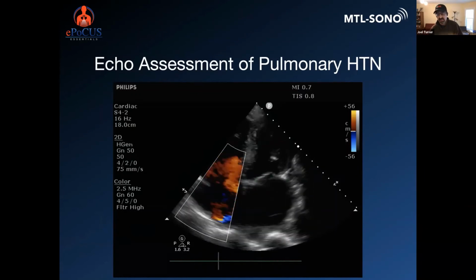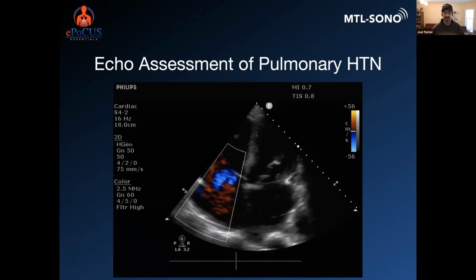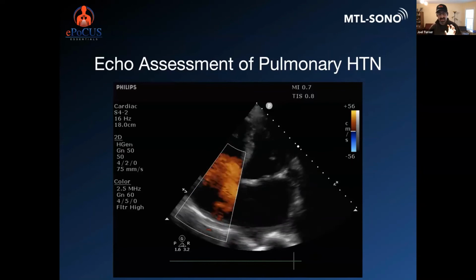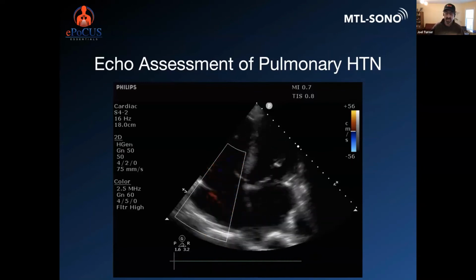In fact, I think 70% of people with normal hearts will have some sort of evidence of tricuspid regurgitation. And I think some of the echo people measure how good the machine is and how good the technician is by the ability to identify and find patients with tricuspid regurg. So the presence of tricuspid regurg does not really indicate any pathology because it's such a common finding.